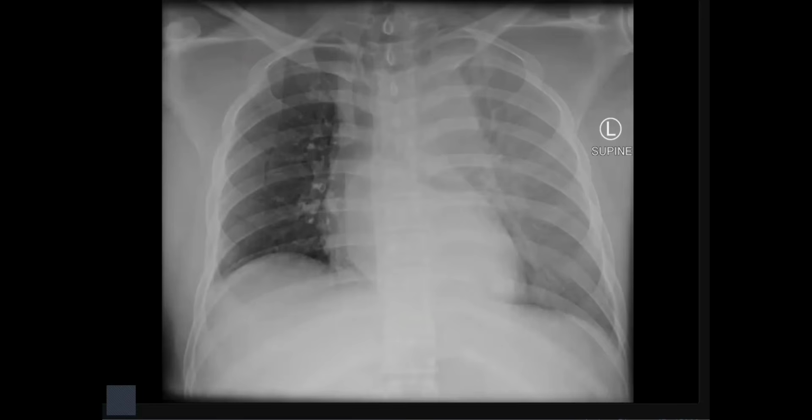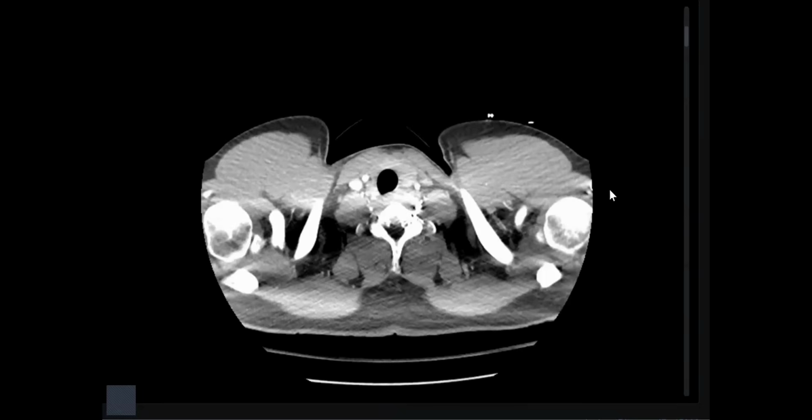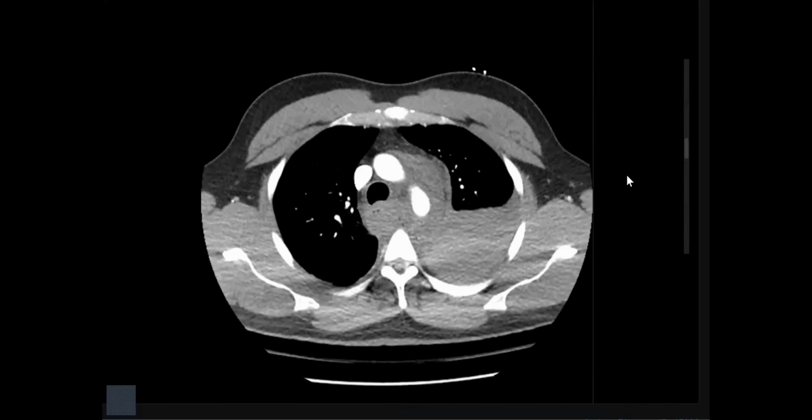For short reporting, we should also indicate this. Okay, I'll give you now the contrast. Just one click and scroll. I've been provided with the contrast. Just scroll without click.